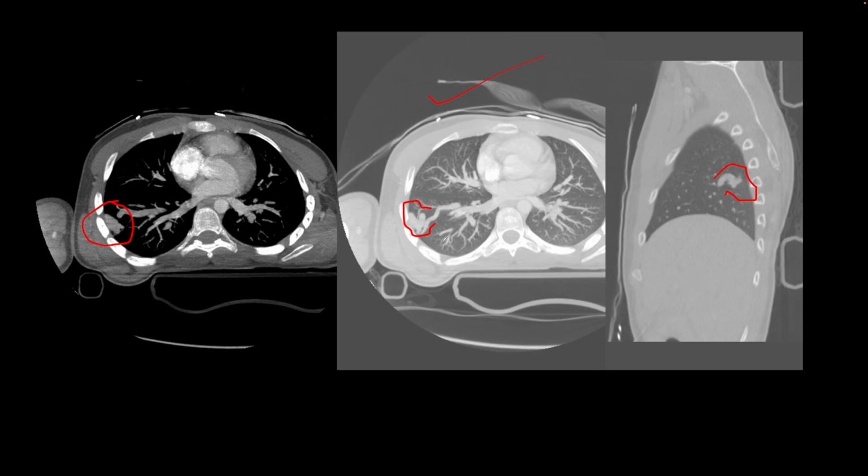And if you scroll up and down, you can trace a communication with either a pulmonary artery branch or a pulmonary venous branch, or both. These are important to identify and report on images. Generally, these are incidental.